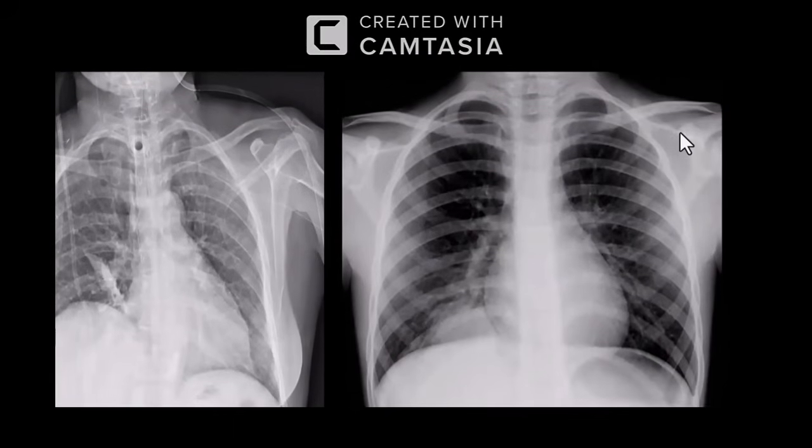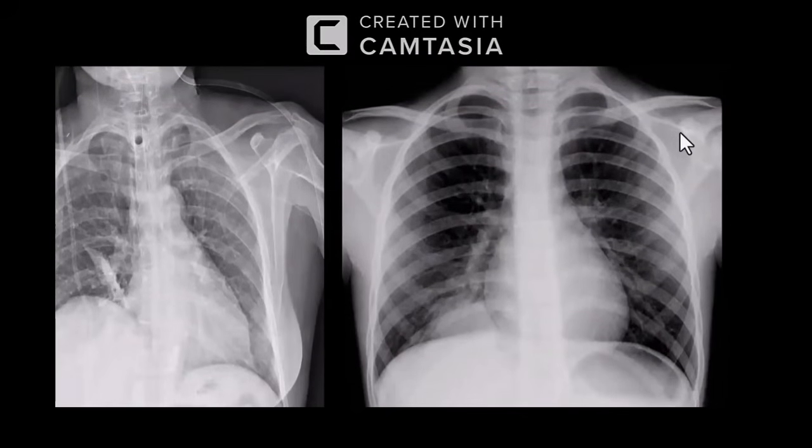This is a 6-year-old with dry cough, frontal radiograph of a skeletally immature patient. I can see that there is a hazy opacity that is projected at the lower lung zone. It is not silhouetting the hemidiaphragm and it is not silhouetting the right cardiac border. So it can be in the middle lobe lateral segment, which is why it is not silhouetting the heart, or it can be round pneumonia. Just because of the round configuration, it is not silhouetting the cardiac border.